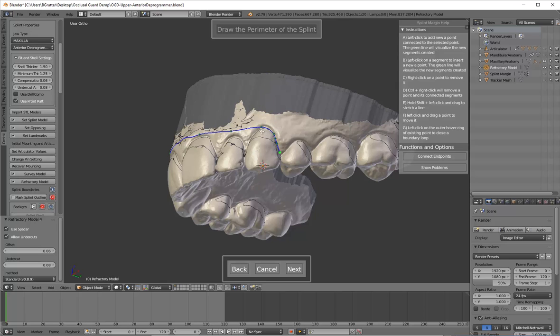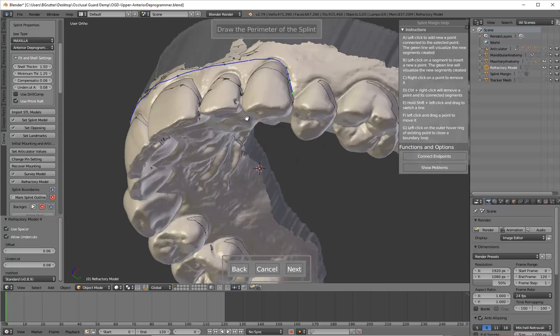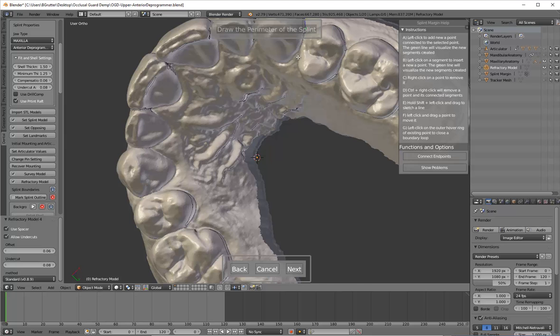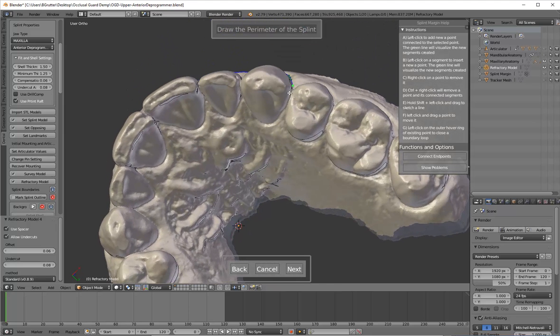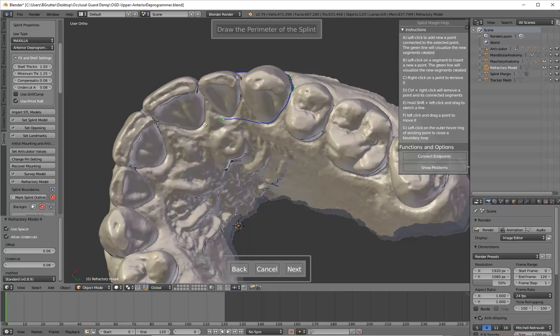You see this red line and this orange? That's because it's having problems, and it automatically resolved that. It knew that didn't make sense. But sometimes it can't, and that's where you'll have to go ahead and add some dots yourself. Anyway, I wanted to comment on that because in the previous videos I wasn't getting any of that, and I was trying to describe it, but another little red one. Let's watch it disappear. Then it changed over there, and now it's good. It keeps adding little dots, little nodes to try to resolve it on its own.